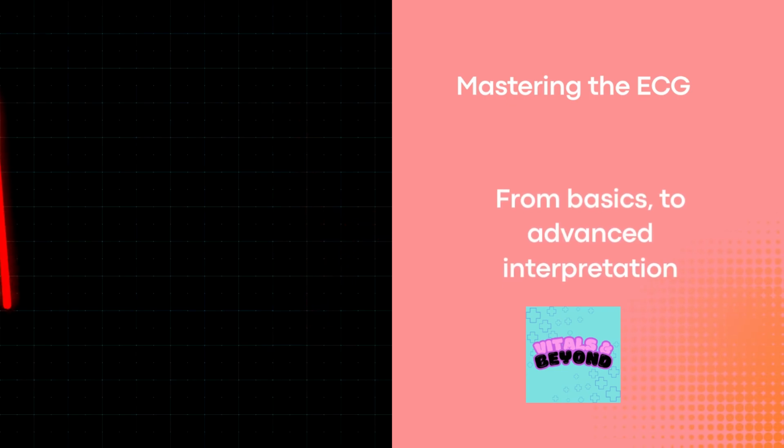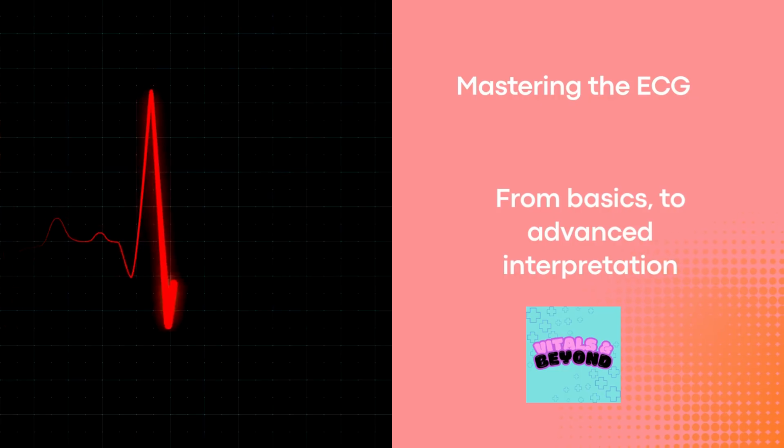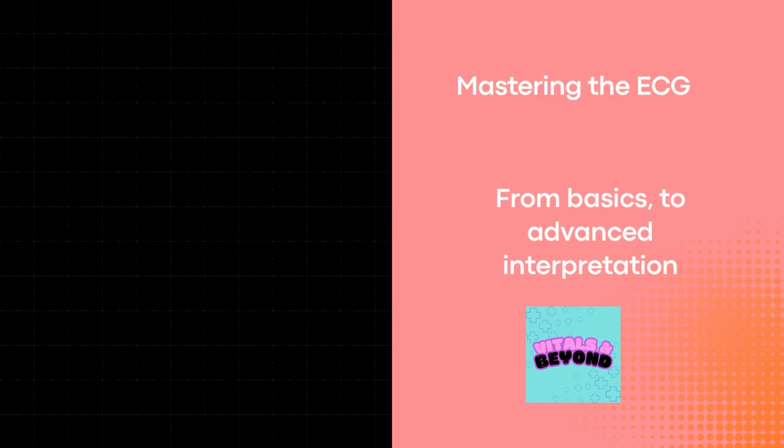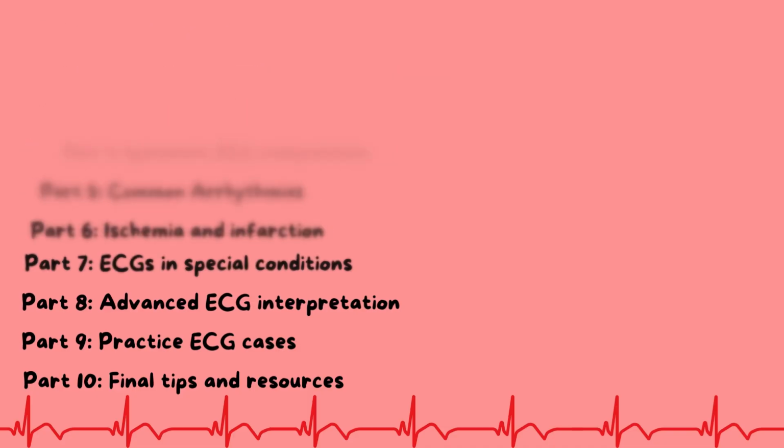Welcome to Mastering the ECG, your complete guide to understanding and interpreting electrocardiograms. From basic waveforms to advanced clinical patterns, this series will teach you everything you need to know about reading ECGs with confidence. This is a 10-part series, and this is part 2.